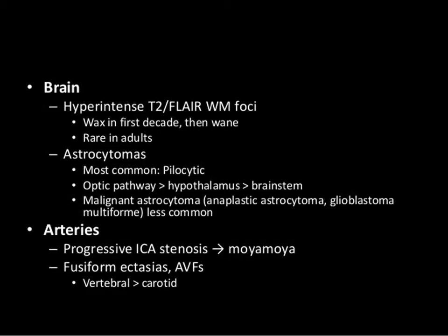Regarding the brain, we have hyperintense T2 FLAIR white matter foci. They are not enhancing. They wax in the first decade, then wane. Rare in adults. Also, we have astrocytoma. What do you mean by wax and wane? They appear, then disappear. Okay, they come and go.